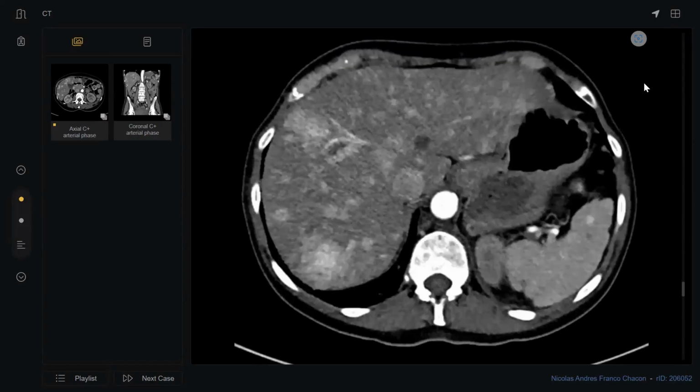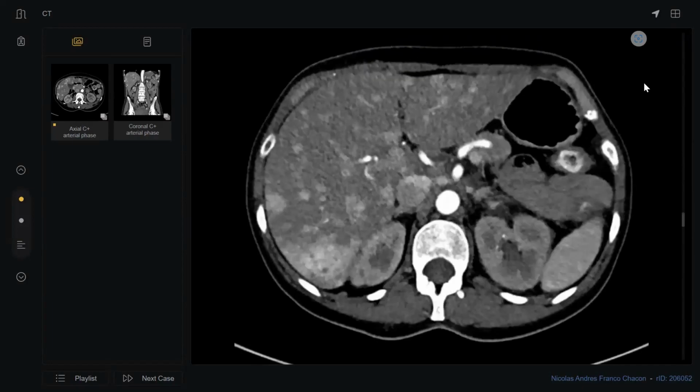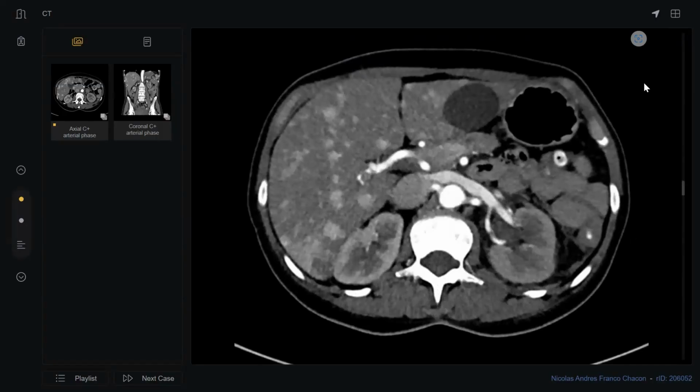Then I give you a dedicated single slide. What happened here? Don't describe more about the metastatic nature in this left kidney, because the case scenario is very clear. When I ask you, so there is something dangerous, new, important for the examiner. What happened here? What's the name of this stage?